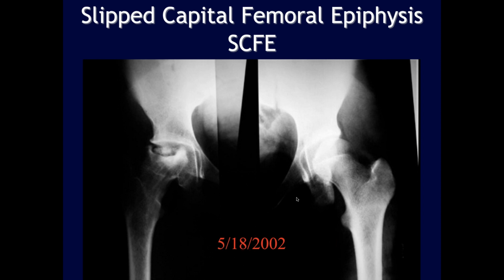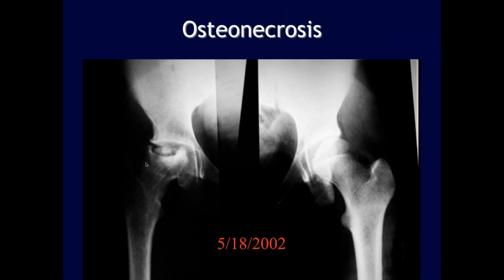I didn't pray enough. There's significant lucency throughout the right femur, probably some disuse osteopenia, and then of course the superior aspect of the femoral epiphysis there looks like there is an osteochondral injury, a fracture, and it looks unstable. It's AVN. Yeah, definitely AVN. So the epiphysis became necrotic and basically just became destroyed, and we just see this big defect in the metaphysis. The treatment was excellent, but the problem is they may have been a little too rough.